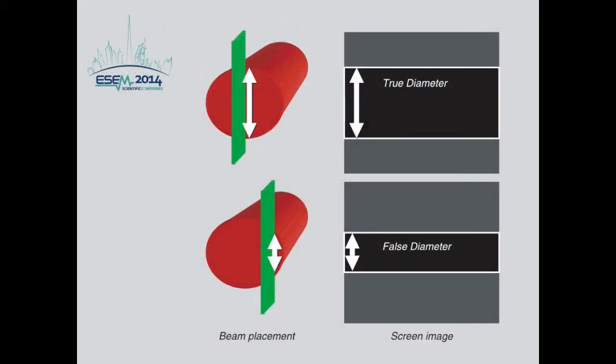In this graphic representation, remember that the abdominal aorta is a tubular structure, and it's being imaged in a plane of the ultrasound beam. Thus, the transverse view is more accurate in terms of ensuring that the true cross-section of the aorta is visualized. When imaging longitudinally, it is easy to see how a falsely small cross-section of the aorta could be measured if the plane of the beam is just off midline. The reason to obtain a longitudinal view is to ensure that you don't miss a saccular outpatching of the abdominal aortic wall.